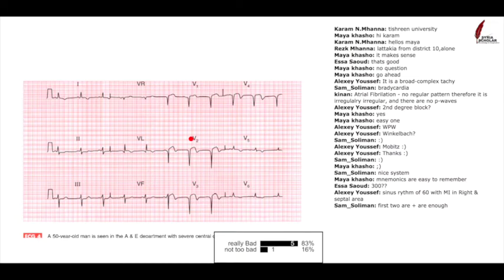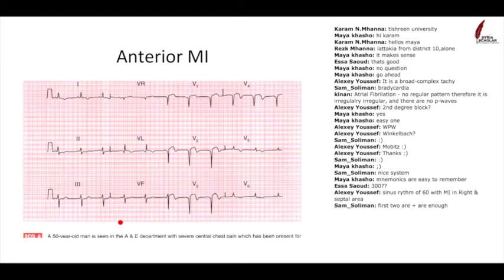So yeah, this is really bad. This is a ST segment elevation myocardial infarction of the anteroseptal part of the heart. So this is an acute anterior myocardial heart attack, basically. This is a very, very big heart attack. Whenever you see ST segment elevation, what that's telling you is this is a full thickness heart attack. The heart tissue, the muscle of the heart, has died, is infarcting the whole length of the way through the heart. So there's a big hole that is just dead tissue now, all the way through the heart, because that's what these ST segments are showing you. So this is a really sick person who needs to have immediate heart attack management. He's having a very big heart attack. Anterior myocardial infarction.